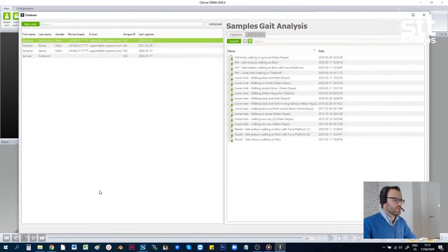Great, let's move on to a second group of enhancements. In this case, I want to mention a couple of new features related to the database. Now, the searching capabilities in the website have been improved a lot, so it's easier to look for things inside, especially if you have a lot of patients, right?